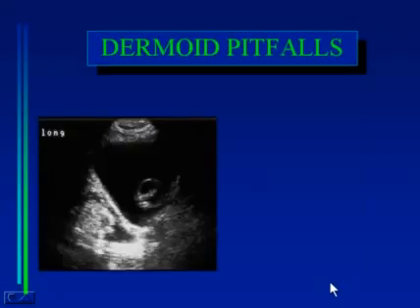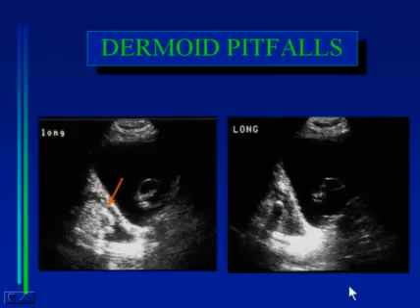How about abnormal bowel? Well, this was a case in which we felt rather confident that we had the diagnosis. This patient presented with right lower quadrant pain and had a highly echogenic focus in the right adnexal region. The echogenic focus seemed to be part of a larger mass, which was hypoechoic around the periphery of it. And the echogenic focus looked a lot like a dermoid plug, which is what we thought it was. And we thought we had really found the diagnosis then when, in addition to our dermoid plug candidate, we found a highly echogenic focus with posterior shadowing. That, we thought, might represent the calcification or the tooth within the dermoid. However, this proved not to be the case.